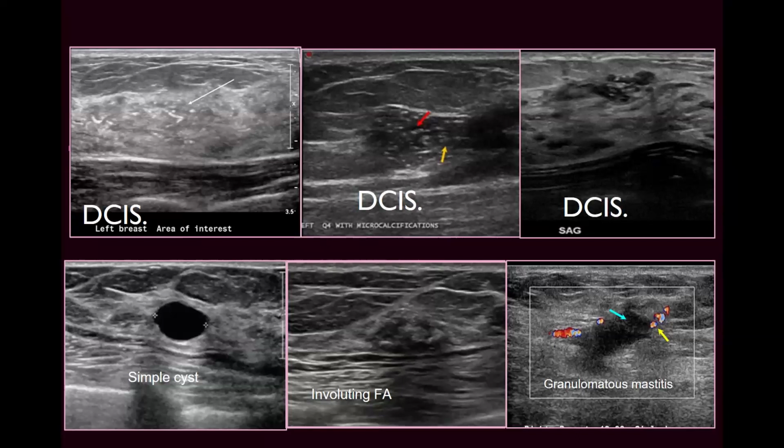As you know, usually we see breast pathology within the mammary zone. This is where the gland is present, the ducts and terminal duct lobular units, and almost all pathology arises from these, either from the terminal duct lobular unit or from the ducts present within the mammary zone.